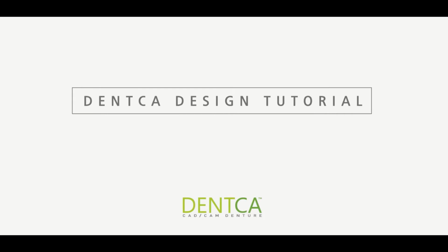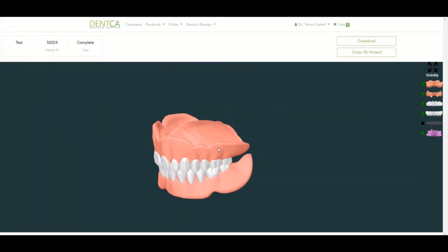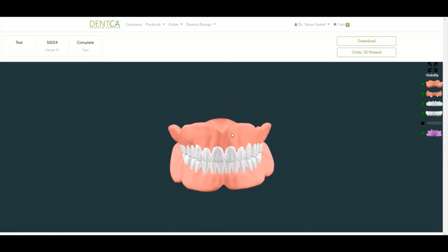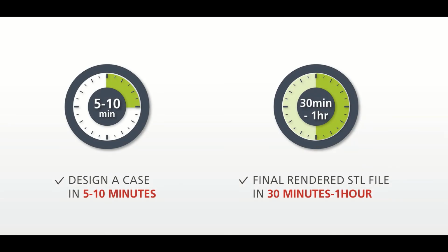Welcome to DENTCA Design, the first web-based denture design software. In this video, you'll learn how to design a digital denture using the DENTCA Design software, as well as an in-depth explanation of all the special functions added to better customize your cases. You'll be able to design a case in 5 to 10 minutes and have the final STL file rendered in 30 minutes to an hour.